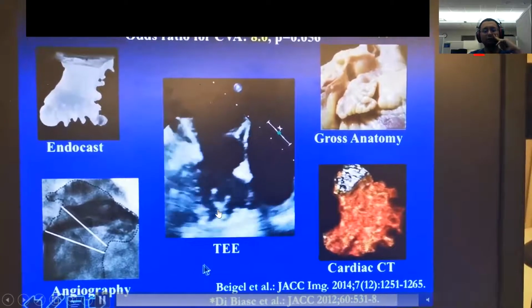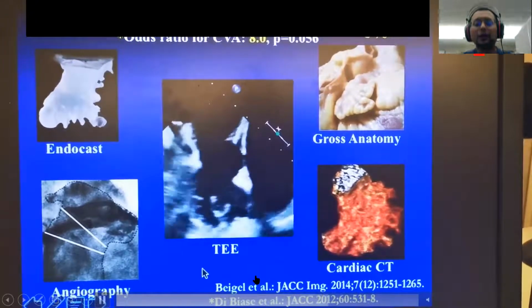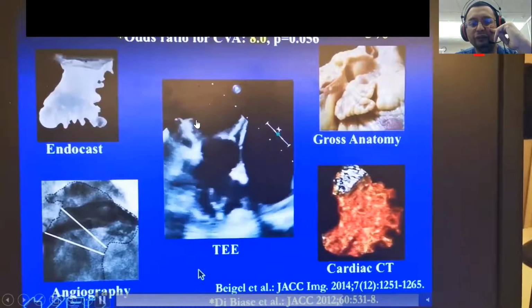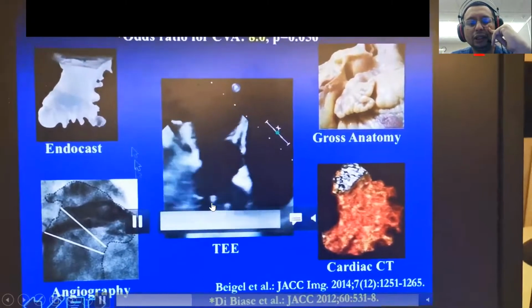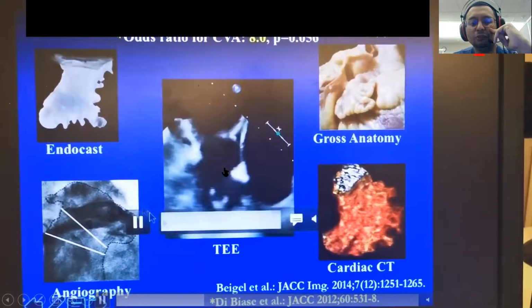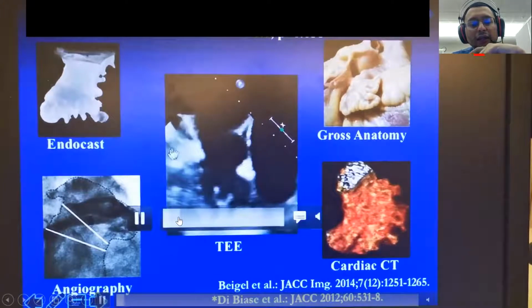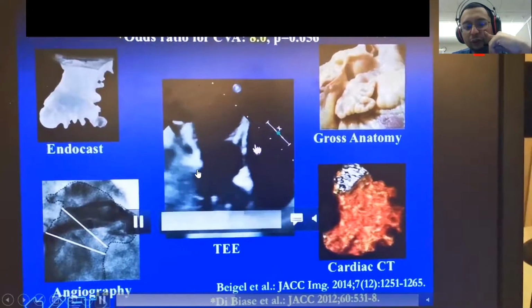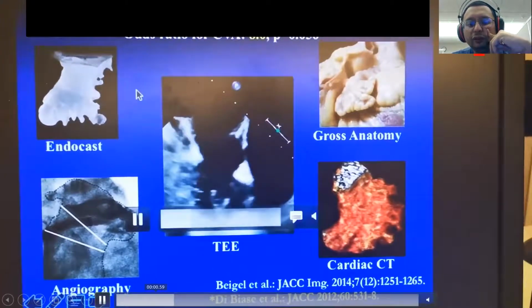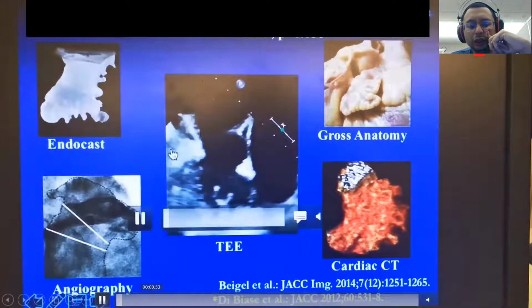The pectinate muscle is actually a very important structure to define whether you are looking at left atrium or right atrium. In the right atrium, the pectinate muscle extends all the way out of the right atrial appendage. So if you see an appendage that has pectinate muscle outside of the appendage, then this is a morphological right atrium. In the morphological left atrium, the pectinate muscles don't go out. Furthermore, the left atrial appendage is narrow and like a finger-like projection. There are a few different types of left atrial appendage, because we know that the left atrial appendage is associated with stroke.